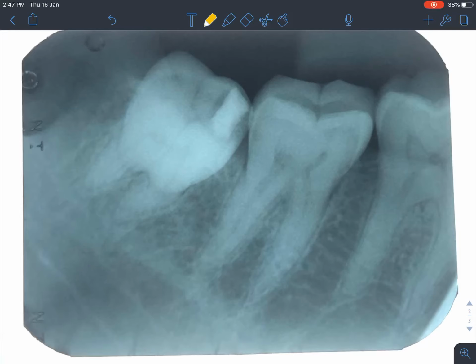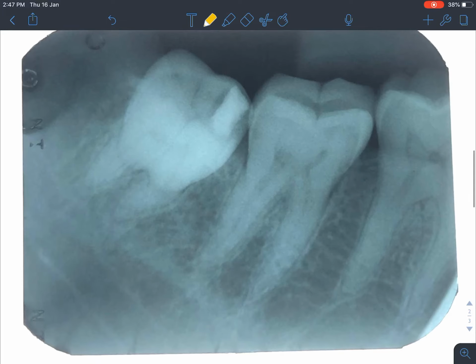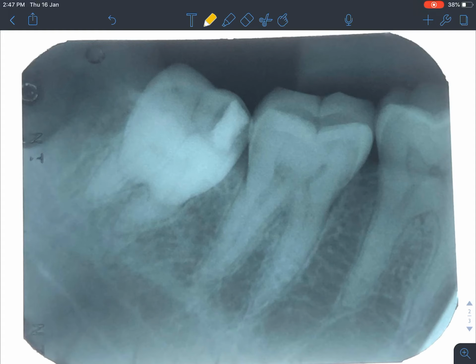Yeah. So today we are discussing radiograph interpretation. So this is which quadrant? Fourth quadrant. Fourth quadrant, okay. And then we are seeing 4-6, 4-7, and then 4-8. So, landmarks? We generally follow the pattern of radiographic interpretation.